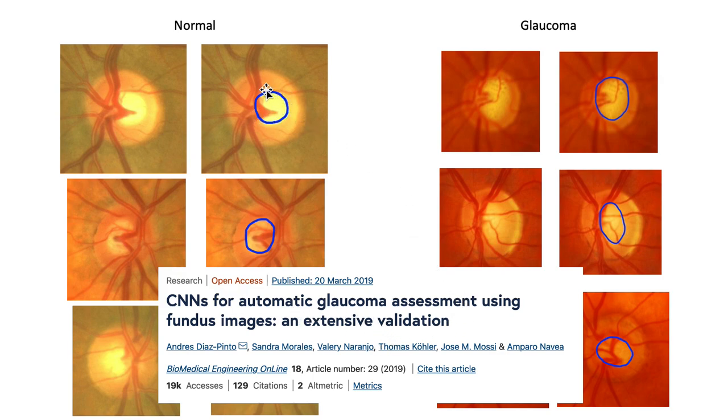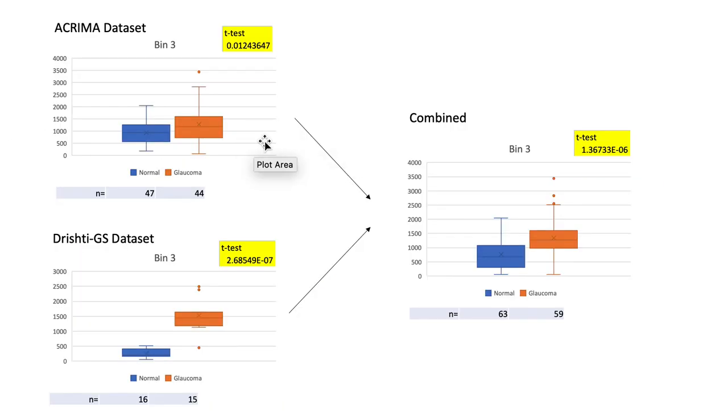And just as a reminder, previously we outlined the shape of the optic cup and extracted that to measure its shape via Shape Genie. And I will leave out the methodological details. You can watch that in the previous video. But just as a reminder, this is the data that we found.